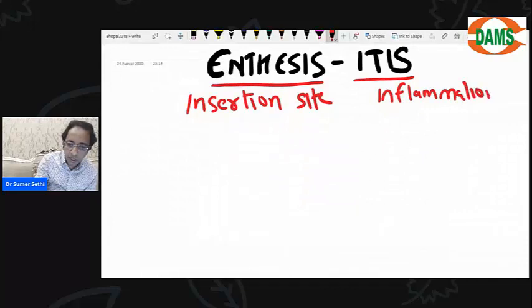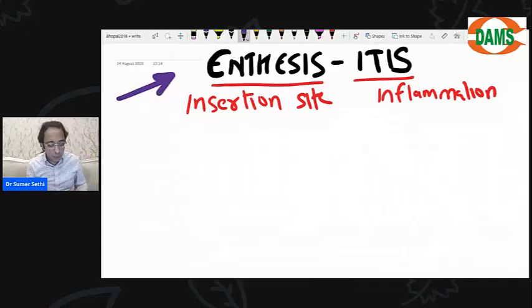Okay, this is something that you never saw in rheumatoid arthritis. Rheumatoid में नहीं था, ankspons में होता है enthesitis. Pseudo widening, I said, because that was not a true widening of the joint. Joint नहीं widen हुआ था, joint destroy हुआ था. But on the X-ray, it looks like widening, so we call it pseudo widening.